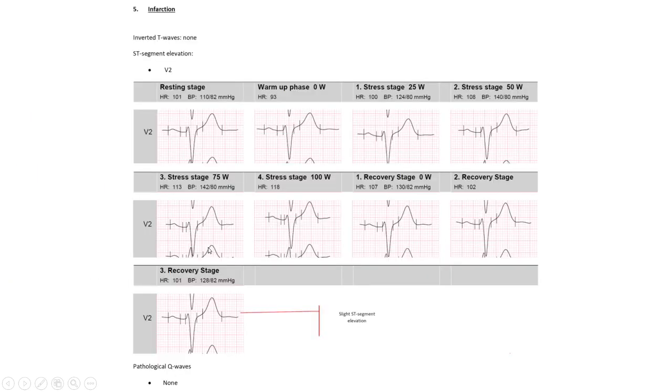Then in terms of ventricular hypertrophy, we look at lead V1, specifically for right ventricular hypertrophy. If there's a big R wave in V1, we can indicate a possibility of right ventricular hypertrophy. Remember, to identify left ventricular hypertrophy, we look at the S wave of V1 and the R wave of V5. We sum those values, and if that exceeds 35 millimeters, it means there's left ventricular hypertrophy. Both of these situations weren't observed in the ECG, so no left or right ventricular hypertrophy.